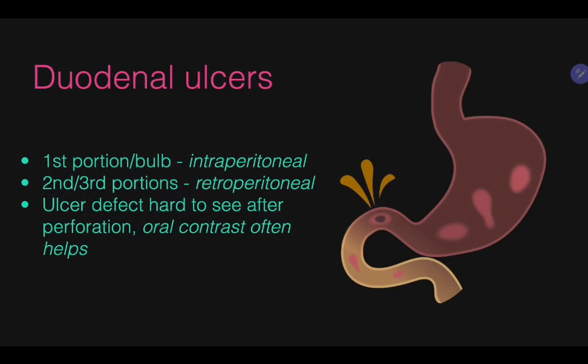We have touched on gastric ulcers, and specifically to keep watch for the pattern of air, fluid, and inflammation to help guide your attention to the right upper quadrant. And I want to give you a few additional tips for your evaluation of duodenal ulcers.